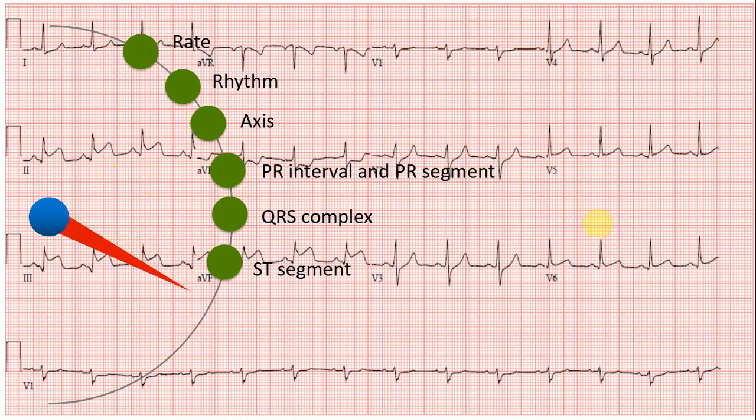Right, so we have got some issue with this patient, right? I have not finished yet, so let's complete it. So look at the QTC. If you look from the beginning of the QRS complex to the end of the T wave, that is about 5, 6, and maybe 7, 8, 9. So 9 multiplied by 4 is 360 milliseconds, which is pretty normal.